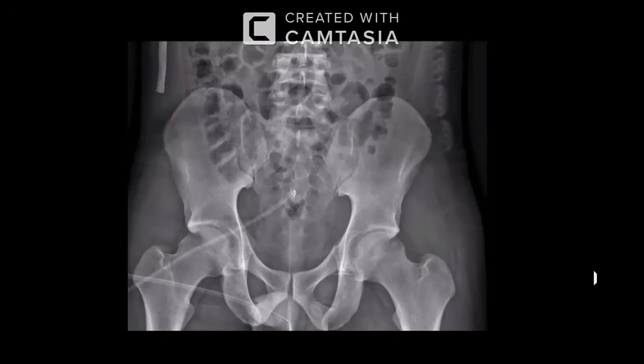Okay. So you said it's a suprapubic catheter, but see this, it's folding on itself, right? So this is somewhere outside on the skin surface. These are not a suprapubic catheter. So be very careful when you're given this in the exam and look at its continuity. You can actually see it is just going somewhere here and it is just folding up here. So it's not related to the suprapubic catheter part. Okay, so yes, the description was correct.